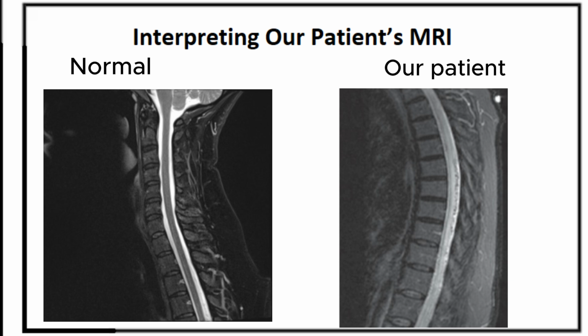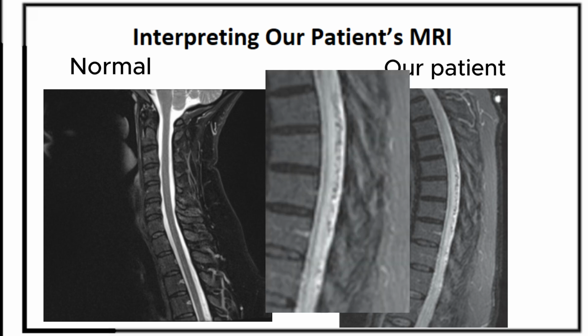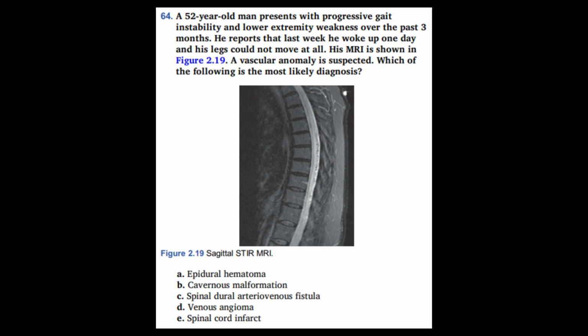The spinal cord is not supposed to appear white. There is no fluid in a healthy spinal cord. These two features, which include the swollen and diffuse bright signal, or the hyperintensities, in several vertebral levels, coupled with the flow void, should raise a red flag. What is our diagnosis based on this MRI? Well, the correct answer is a spinal dural arteriovenous fistula.